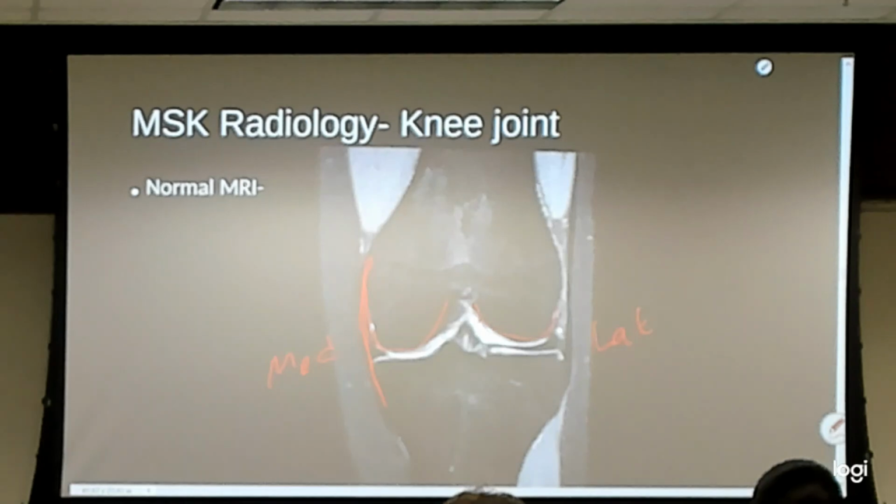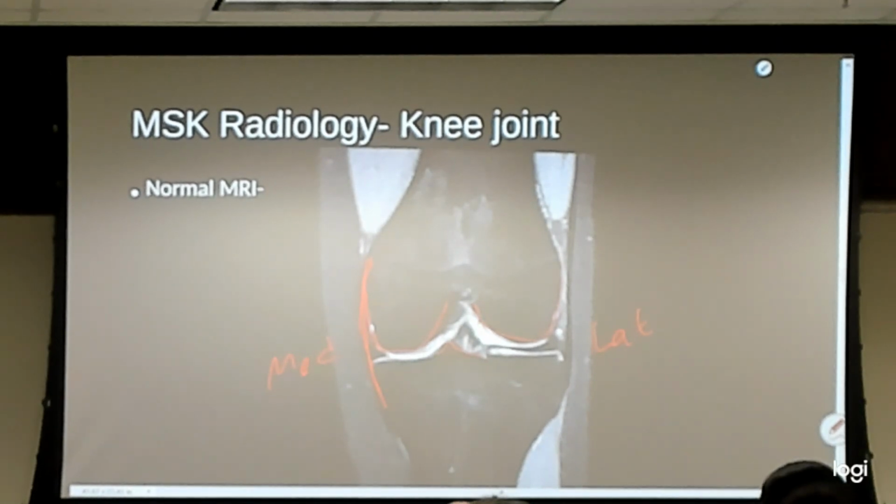if there are articular surfaces. Tibial spines, two structures in the middle. This one has one, yours has two bumps in the middle. The tibial plateau, so that's this entire surface here, the flat tabletop at the proximal tibia.